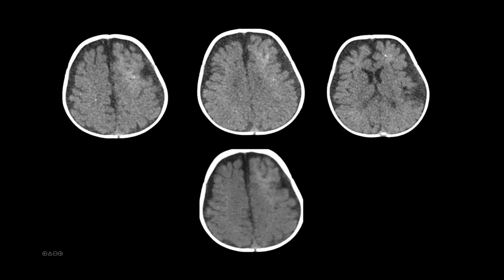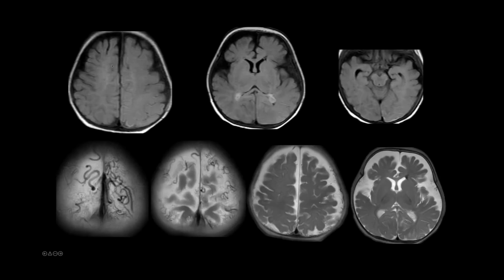So there are some hyperdensities in the cortical regions on both sides. Calcification predominantly in the bilateral region, predominantly left frontal region. Yes, sir. And on the MR FLAIR, you can see the choroid plexus is demonstrating some hyperplasia. There is some atrophic change along the right frontal region in comparison to the left.